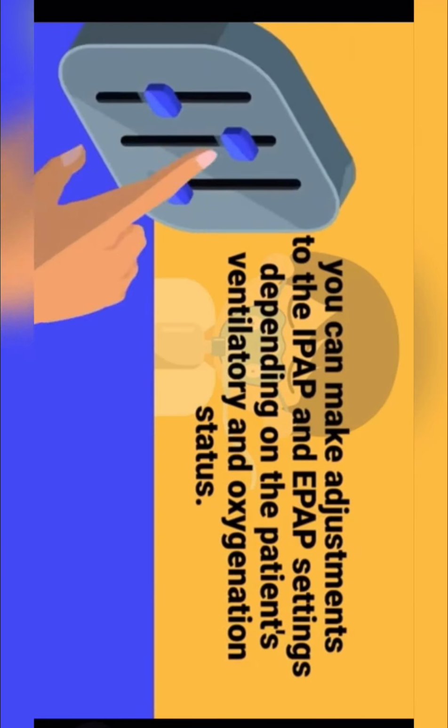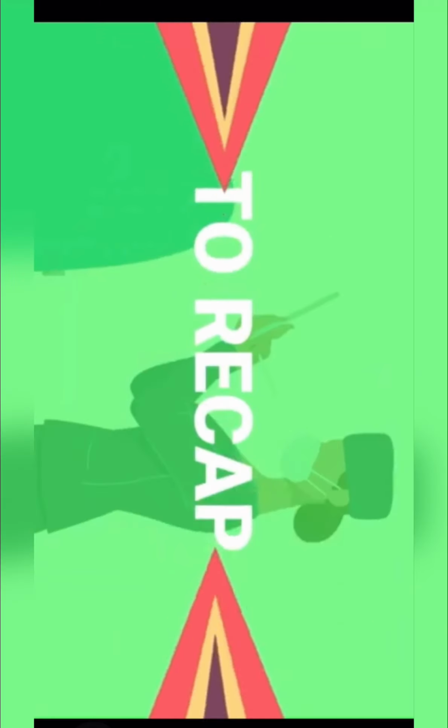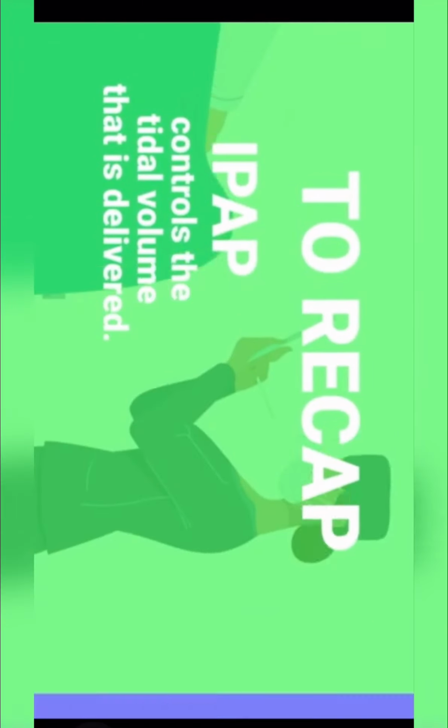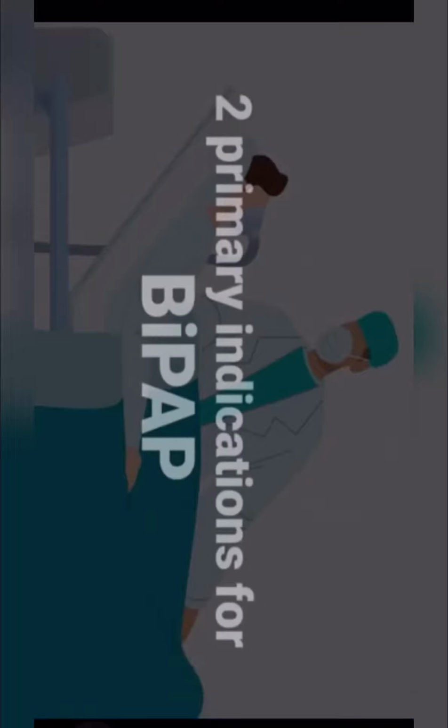Essentially, you can make adjustments to the IPAP and EPAP settings depending on the patient's ventilatory and oxygenation status. To recap, the IPAP controls the tidal volume delivered, and EPAP functions as a PEEP to support the patient's oxygenation.